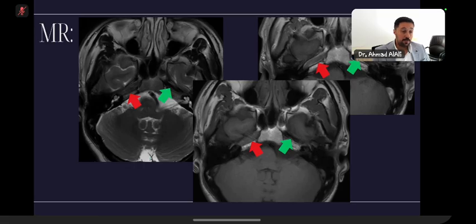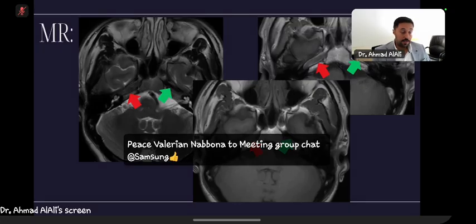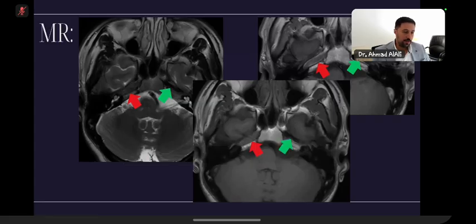And since these emboli are showering and they showed some restricted diffusion, if you correlate between them, you could see that the ones that are restricted aren't the ones that are enhancing. The second thing is that the enhancing lesions that you could see are leptomeningeal, but they are crowded and they are not the restricted ones. So it means that they are in the subacute stage.